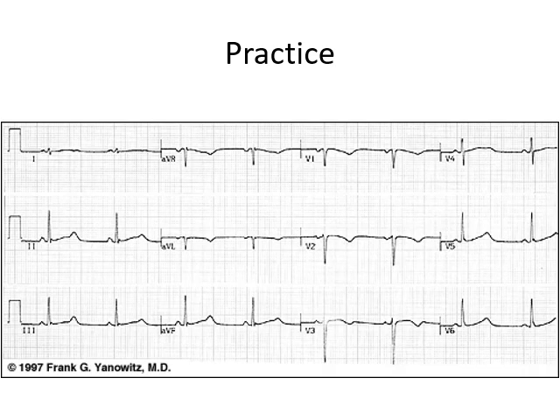Let's have a look at one more ECG. Let's start marking QT intervals. So let's mark this as from here to here. You can clearly see that it is more than or equal to 3 large boxes. And in some other leads, if you want to see, it's here to here. This again is approximately 3 large boxes, which tells us that this is a prolonged QT.